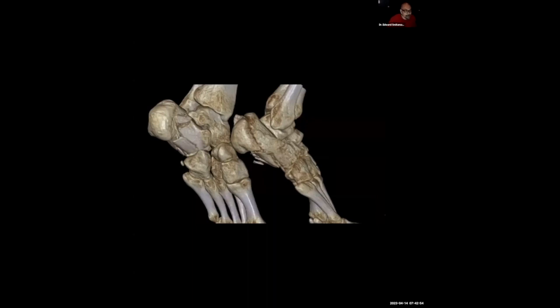Here are some 3D reformatted images from the same patient, where we were able to scan and get both calcanei. I believe this was an unfortunate case of a border jumper, but we can see here these comminuted intra-articular fractures of the calcanei. This is just to remind us that these calcaneal injuries are typically polytrauma, and you also want to make sure that they don't have contralateral involvement, as in this case, which can occur in about 15% to a quarter of patients.